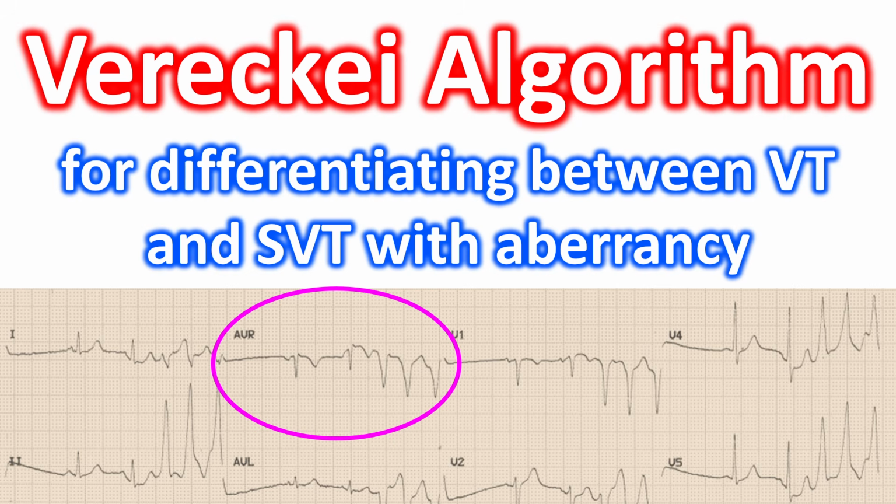The Vereckei algorithm is a specific diagnostic protocol used in ECG to differentiate between ventricular tachycardia and supraventricular tachycardia with aberrancy. It was developed as a simpler, often more accurate alternative to the traditional Brugada criteria. It specifically focuses on the morphology of the AVR lead, which is often overlooked in standard rhythm analysis.